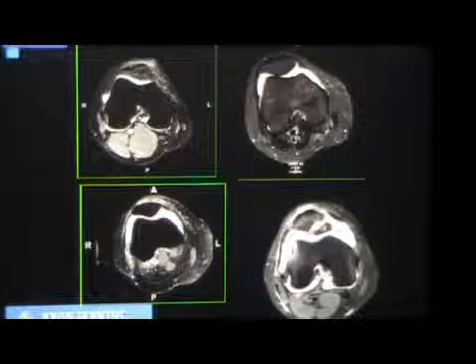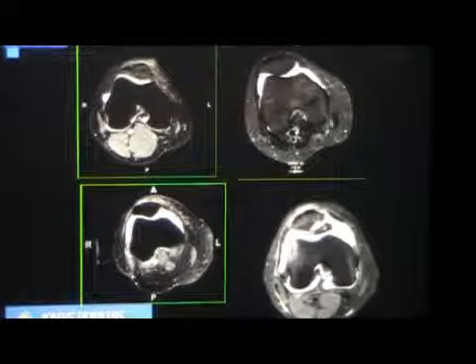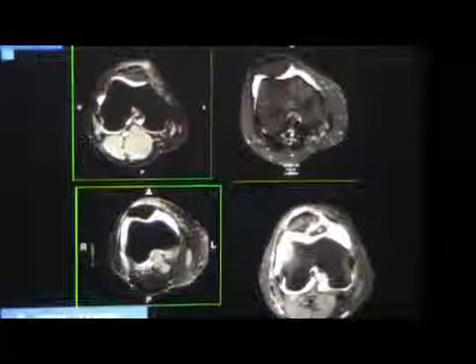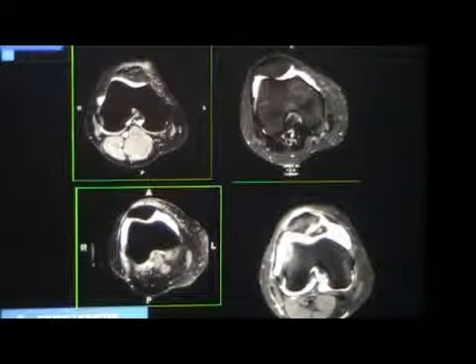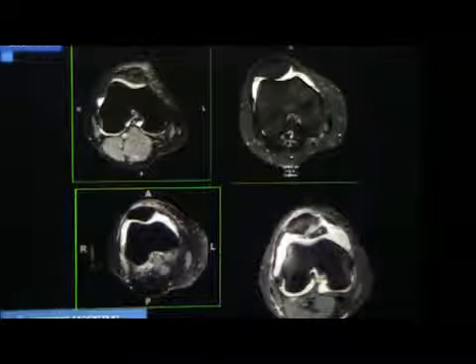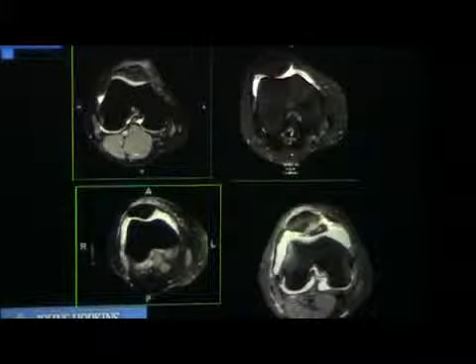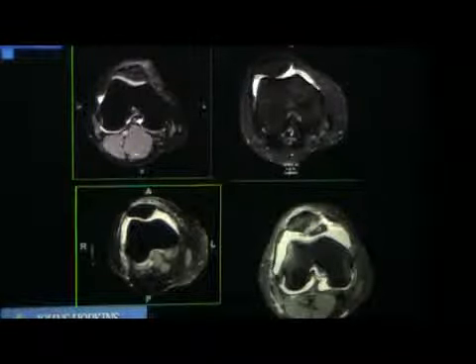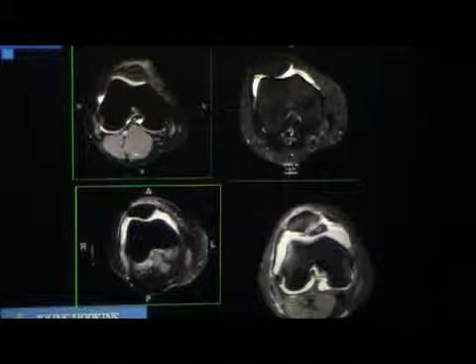So when we're looking at the marrow, you have to decide it's normal, it's red marrow, it's pathologic marrow. If it's pathologic, are we thinking benign? Are we thinking malignant based on T1 and non-fat saturated signals? Okay, if you're thinking malignant, where can we pinpoint? Is it in the cortex, subcortical area, marrow, all that stuff? Okay, so there'll be separate lectures on tumors. I'll be taking one on how to call something benign and not scare the patient. So we'll take all those lectures. But basically, just putting something in your minds, look at the marrow first when you're looking at all these joints.